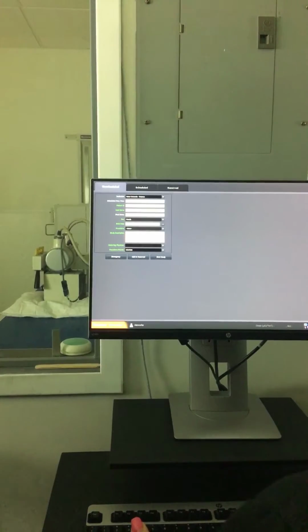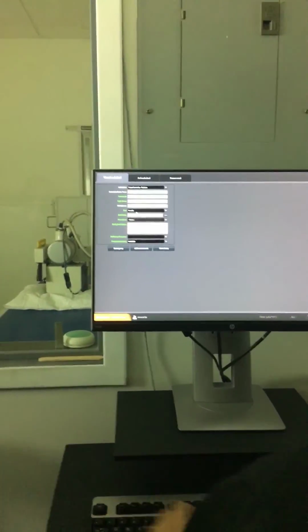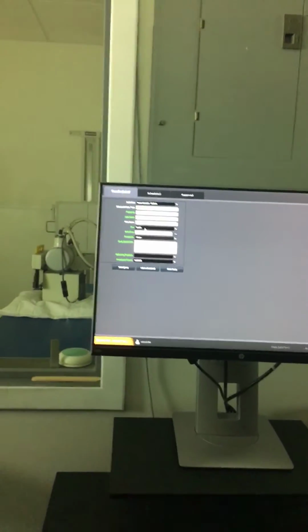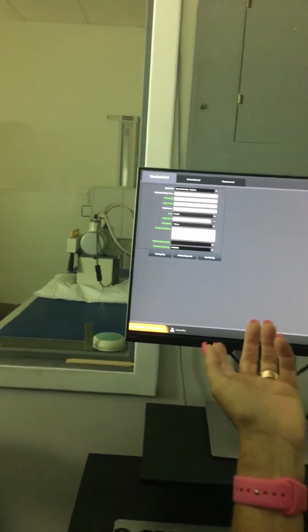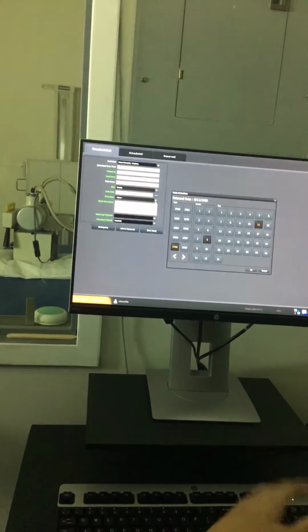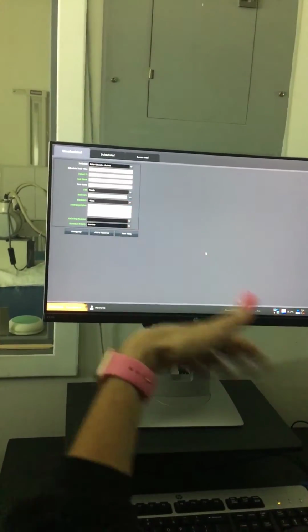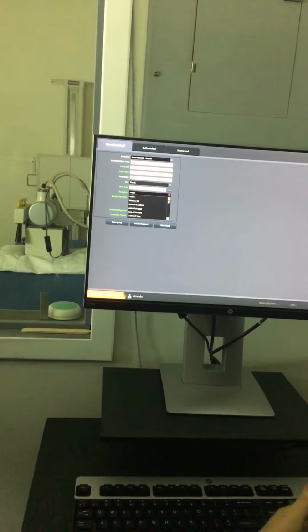Okay. So let's just say we put some bogus number in there. Then you guys are going to fill in your last name, your first name, Trish Mandel, sex, birth date. You can either do it that way, or I think you can click on that and pick it that way. Procedure. And it'll tell you if you did something wrong. Like I did it and I didn't click on that. So then you have to go down here and pick, which everybody will pick.